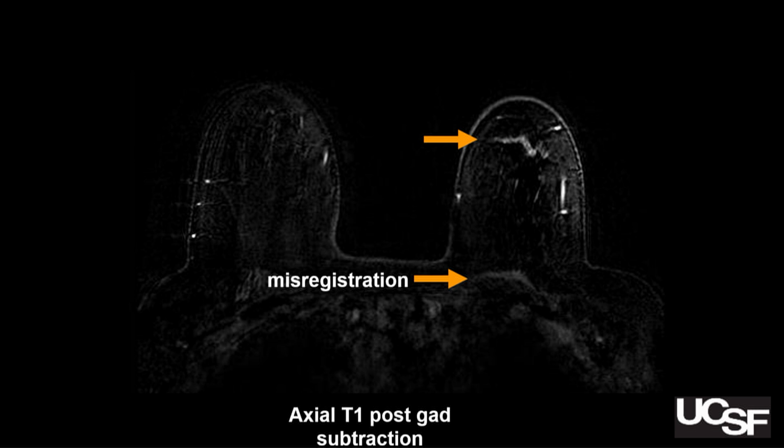And then between the pre and the post, the muscle has changed in configuration. And when the patient moves her pec, like if she tenses her pec, it also is going to shift the breast. Same thing would happen if she lifted her head up in MR. Like in MR biopsy, we really hate it when the patient does that because we tell her, if you lift your head up, you're going to move your breast. And we're looking for something small. And we kind of have to double check and start over at that point.